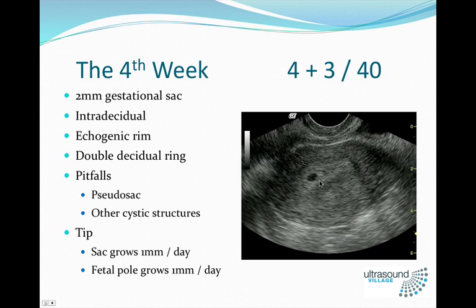And so you can make a mistake. You shouldn't just look at that and go, oh yeah, that's a gestational sac. It could be, but it could be other things too. Very, very useful tip is that a gestational sac grows a millimeter a day.